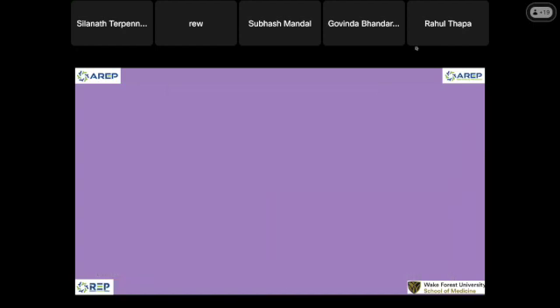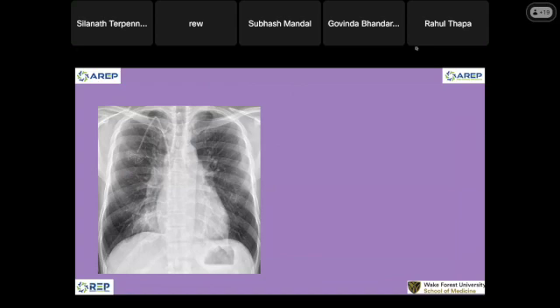All right. I'm showing you different reasons next. This is our patient. And actually, when you are here in the United States, they don't even tell you the clinical presentation. They just give you the chest radiograph and you have to read it. The heart looks okay, you don't even know what else.